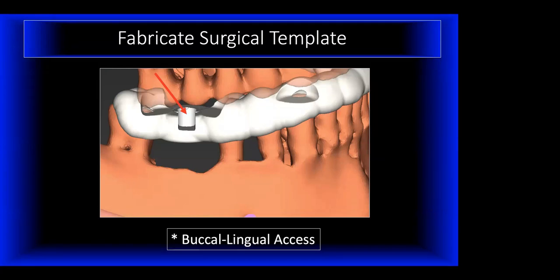When you use these guides or templates and the surgical drills that go along with them, they are usually longer than standard surgical drills. Therefore, it's very difficult sometimes to have access to put the implant drill back that far. So I would like everyone to get used to what is called a buccal or lingual access. And again, 3DX makes them this way. You have to ask for it.